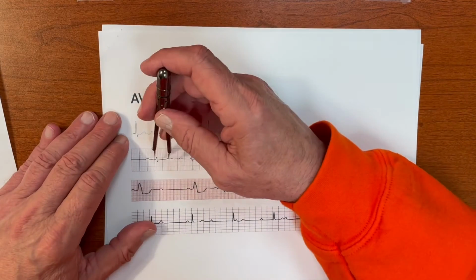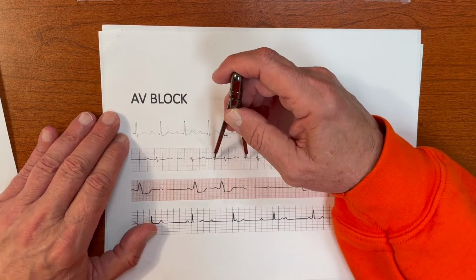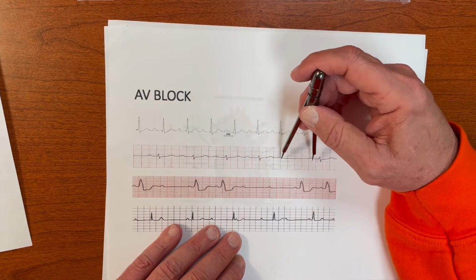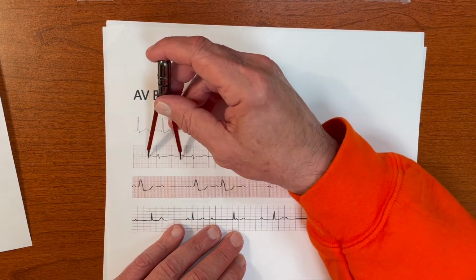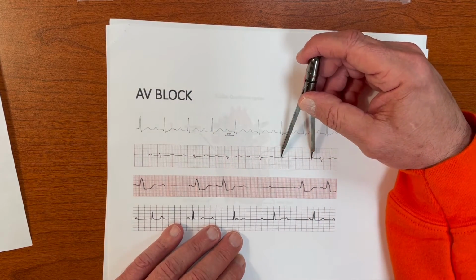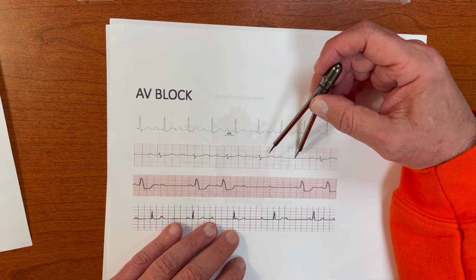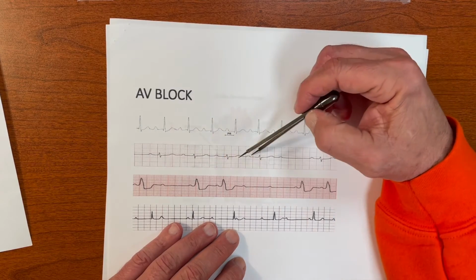How do we tell that was the case? Because the PP interval, which indicates the timing of the sinus node, doesn't change. So we infer this because our calipers never change. The P occurs exactly when it should, in normal fashion, and then all of a sudden it doesn't conduct. We know it's type 1 because the PR got longer.